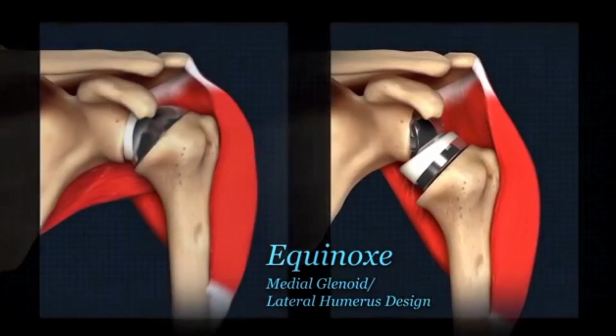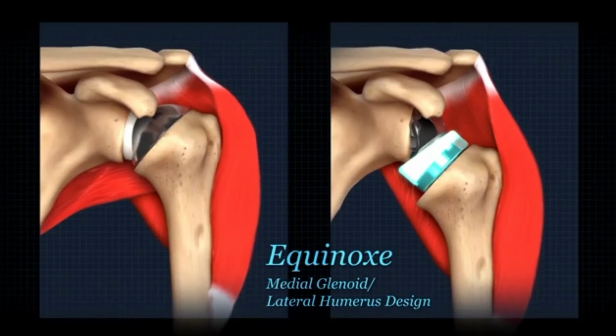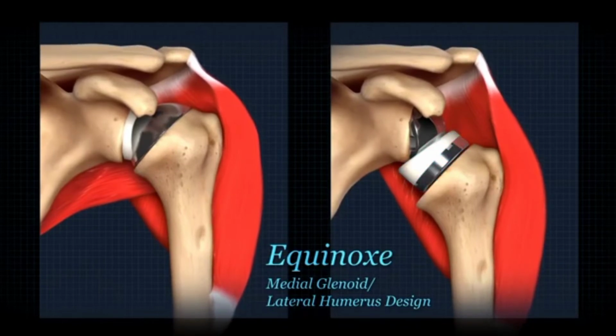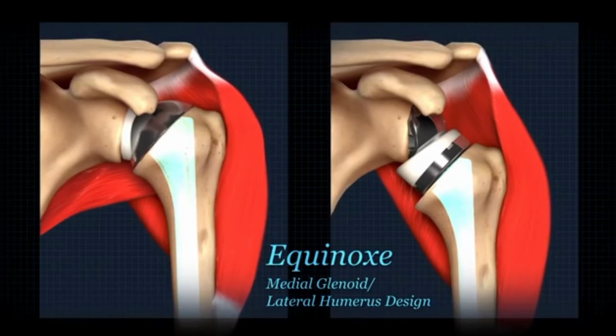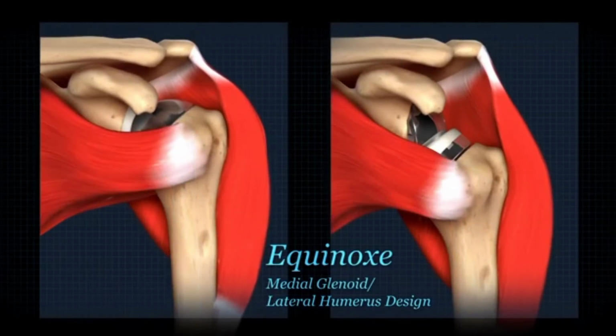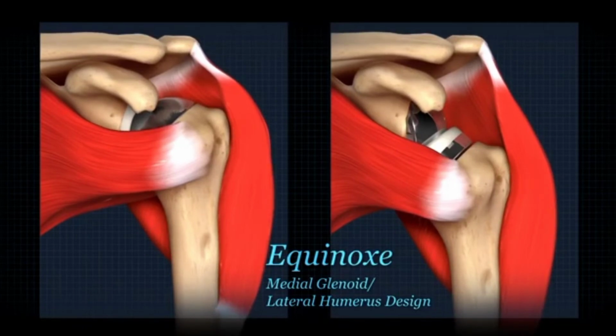Next-generation implant systems achieve this increased offset by placing the liner on top of the resected surface instead of within the humerus. Doing so permits the same humeral stem for both anatomic and reverse shoulder arthroplasty, improving the ease of revisions and reducing the overall cost by retaining the same implant.